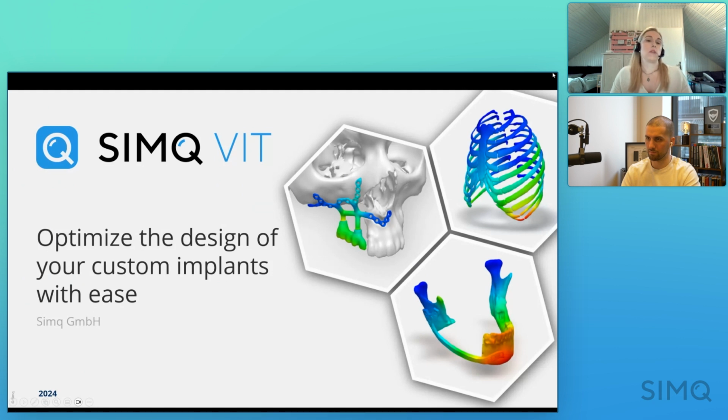Okay, so what is SimQ VIT? The virtual implant testing software that we offer helps optimize the design of custom implants when they're designed by biomechanical engineers and with surgeons. So we can use the finite element method to test load cases on these patient-specific designs and then see how the implant deformation occurs. And then you can go ahead and see, okay, should we take the stress off a little bit here, etc.